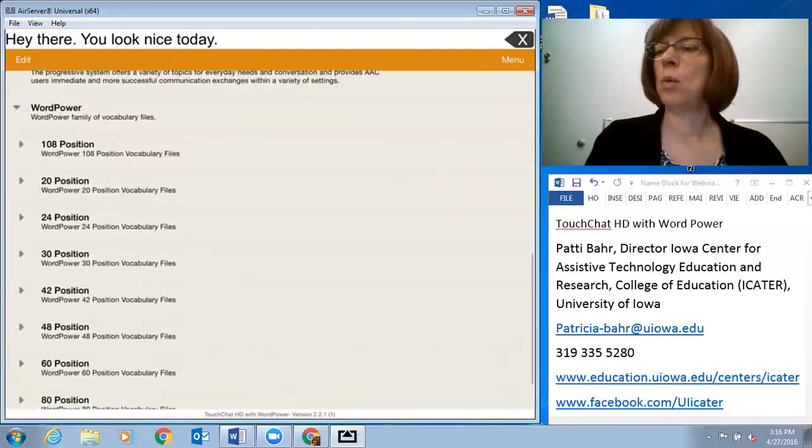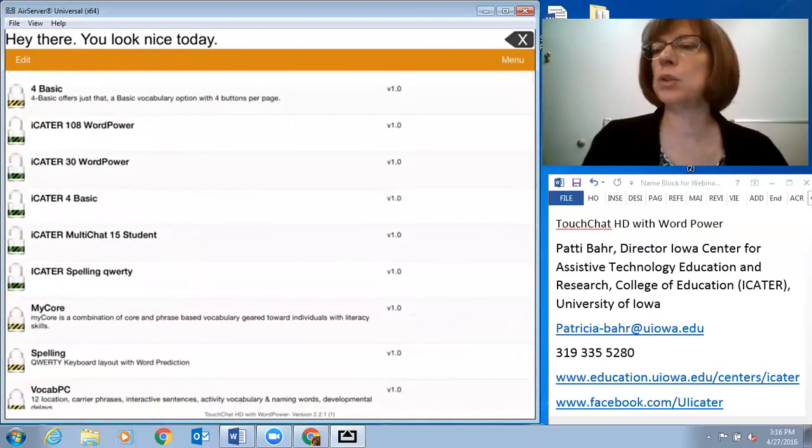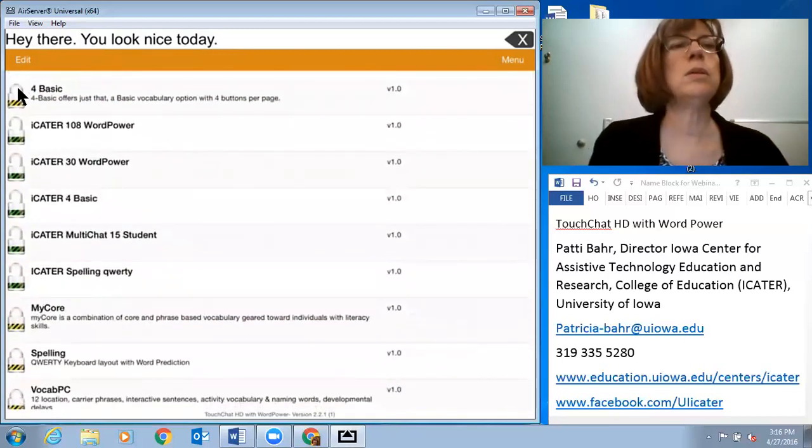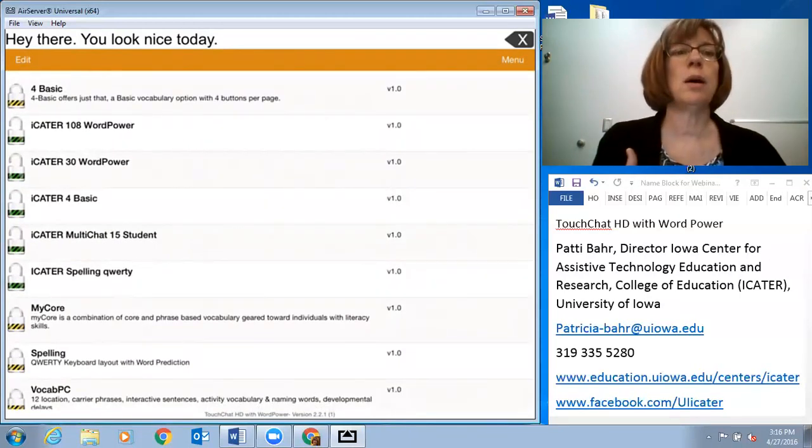And one of the things that you'll notice, if you go way up here, is I had a bunch of these. These are locked. All of these that I was just showing you are locked. But there are these here that are unlocked. I don't know if you can actually see that. These are yellow. These are green. And basically what I did was I copied some of the core vocabulary, or the ones that come with it, and I can modify these.